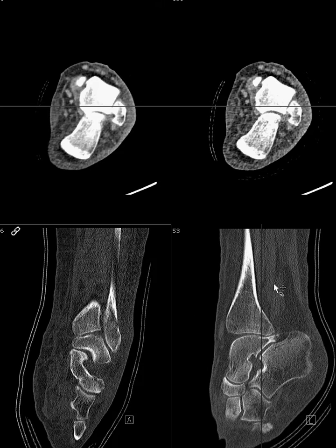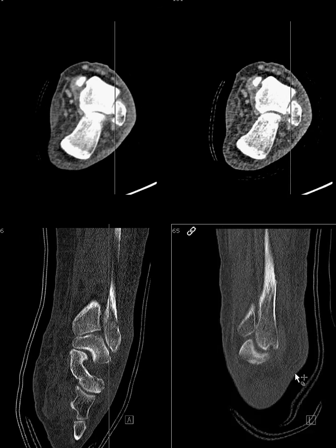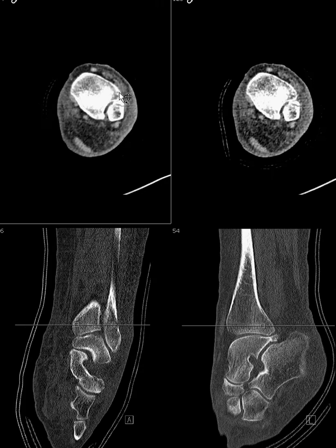Similarly with the sagittal, done perpendicular to the tabletop, again without any regard to the position of the ankle. And so you can imagine, depending on whether the ankle is externally rotated or internally rotated or to what degree, that it is going to make a difference in the appearance, and we're trying to be very consistent with the appearance so that we can use our sort of internal mental database to make good, accurate diagnoses and to make sense of the anatomy. And if we get something different every time, that's a problem. So I want to show you how to do it.